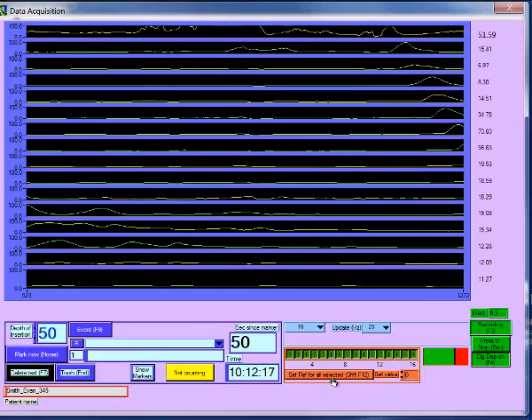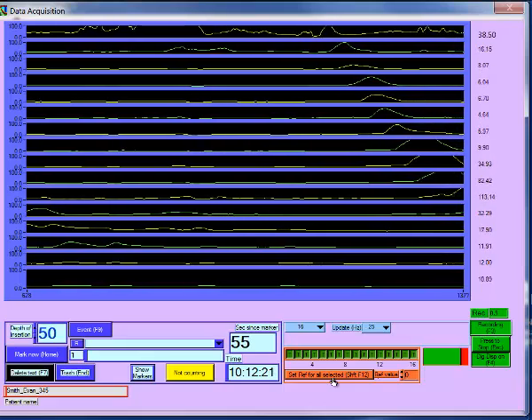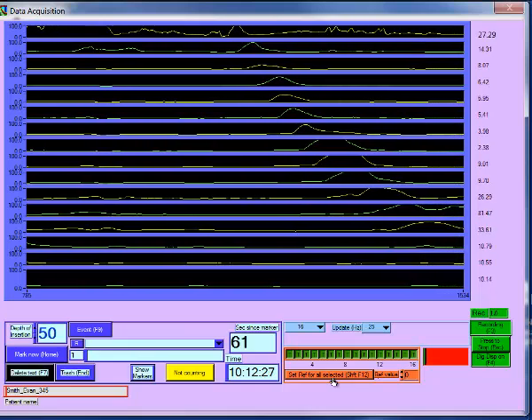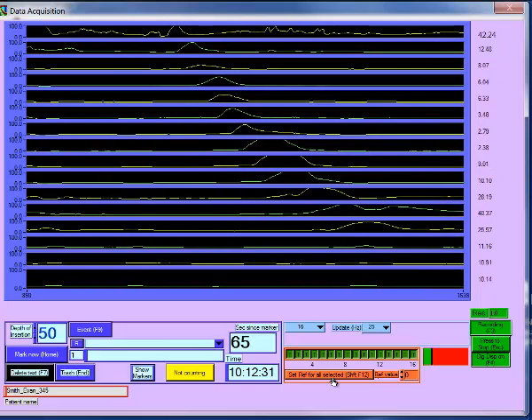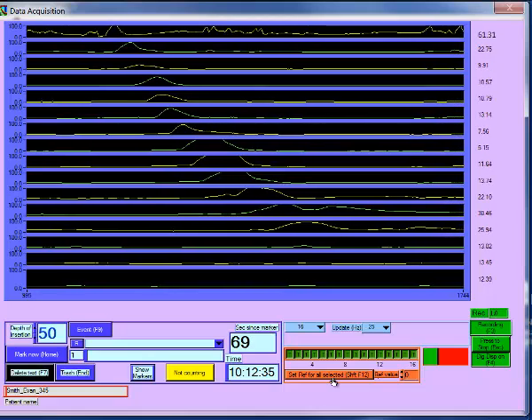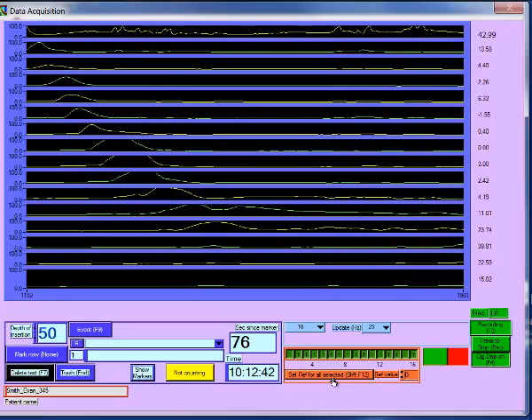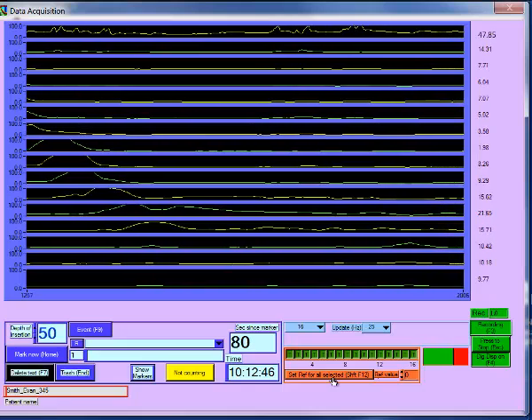The brown button sets the atmospheric reference pressures, which must be done prior to the catheter being introduced into the patient. Setting the atmospheric reference pressure compensates for the differences in pressure required to perfuse each lumen of the manometric catheter, and is performed with the catheter perfused either flat or preferably in a bowl of water. It's also important to have the catheter at approximately the level of the patient, if possible.